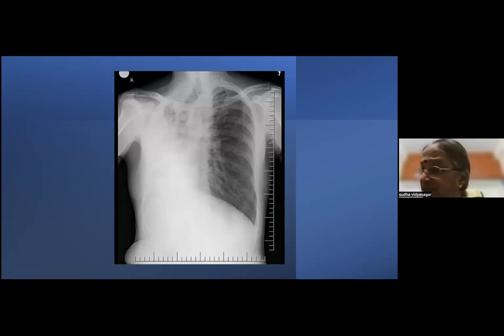I think we'll finish in about 5 minutes. Okay. So the last few x-rays, run through it. Again, this is a destroyed lung. Okay. Don't call it a collapse. It's a destroyed lung. Okay. Showing a lot of fibrosis. The trachea shifted to this side. There are some cavities here. There is a compensatory emphysema on the other side. Okay. So probably is more of a destroyed lung than anything else.